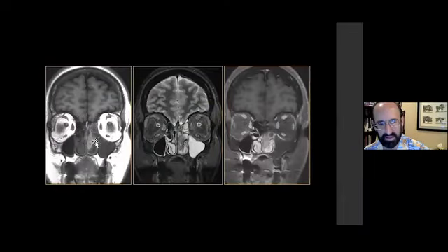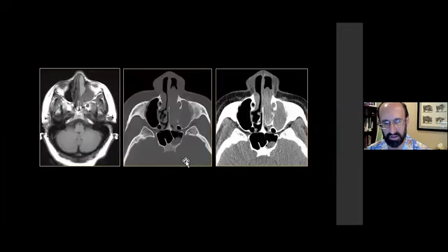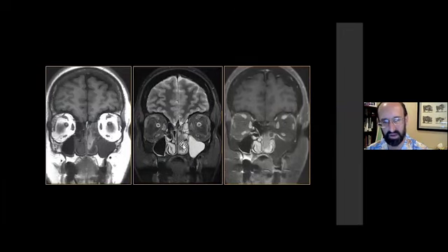When you have this bright lesion in the sinonasal cavity and it is not within the sinus as secretions, you have to worry about either a hemorrhagic lesion or a melanin-containing lesion. In this case, as you can see with the T2 weighted image, this was a lesion that was dark on T2 and bright on T1, which is characteristic of melanin. It might also be an element of hemorrhage.